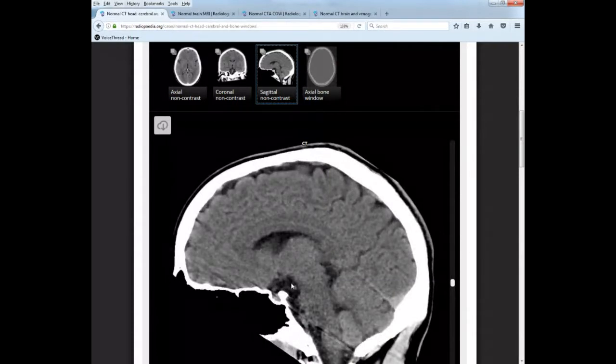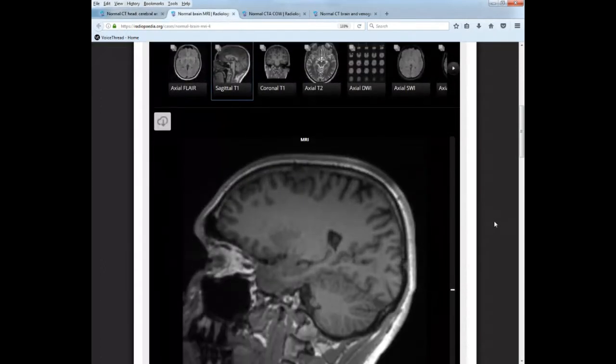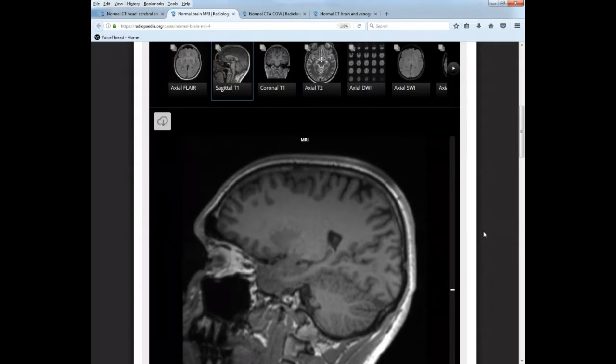All right, so I'm going to switch over to the normal MRI because this is going to be much easier to see the diencephalon and the limbic system, which we're going to move on to next. So, diencephalon: the thalamus, hypothalamus, pituitary, epithalamus. You're not going to be able to see epithalamus, done, end of story. Hypothalamus, so-so. Thalamus, pretty easy to see. Pituitary, pretty easy to see.